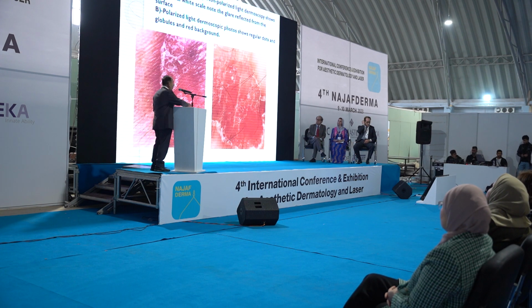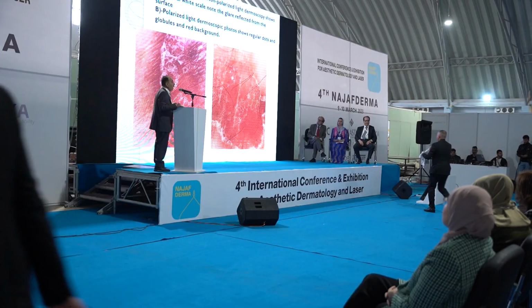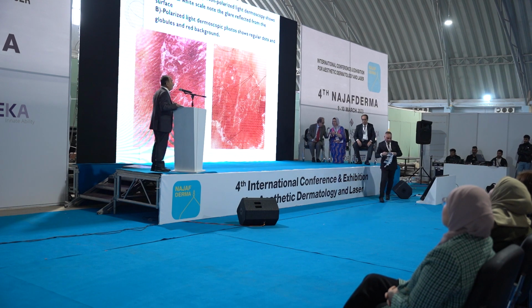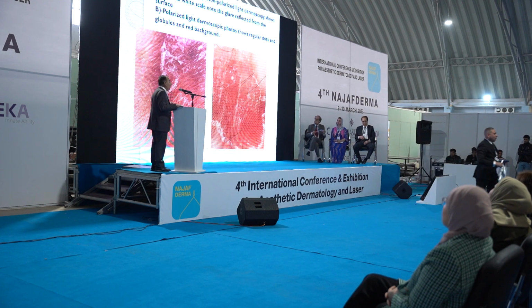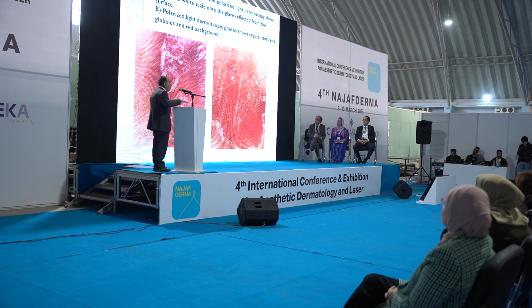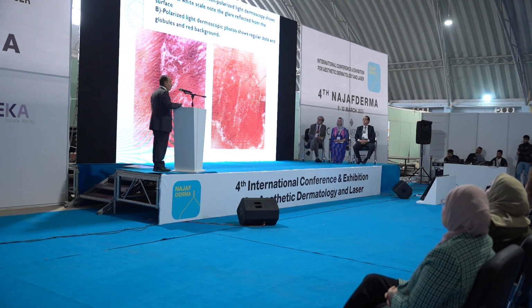Now, let's take a look at some of these diseases which I have mentioned, psoriasis, eczema, and lichen planus, and we try to apply what we have said before. The picture on the left is taken with a non-polarized light, and non-polarized light will reflect to you the surface of the skin. It does not go beneath the surface. And you see scale. What is the color of the scale? It is white.